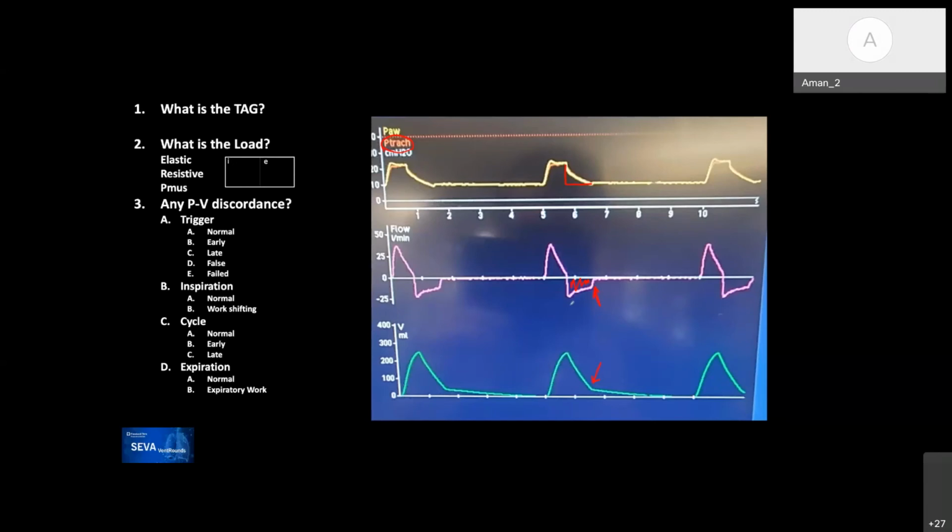Yeah, it opens. I'm not sure what's the impetus for it opening. Just curious, because at that point the expiratory flow actually decays down to zero. If there's low resistance, I wonder why it would decay down to zero if the valve's fully open at this point.